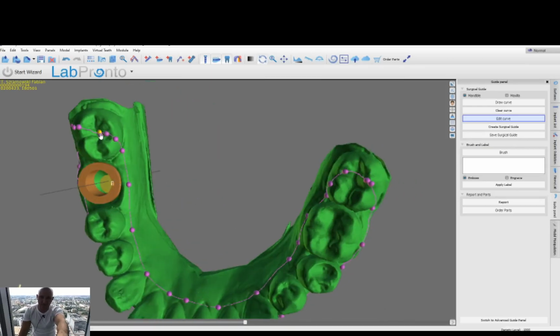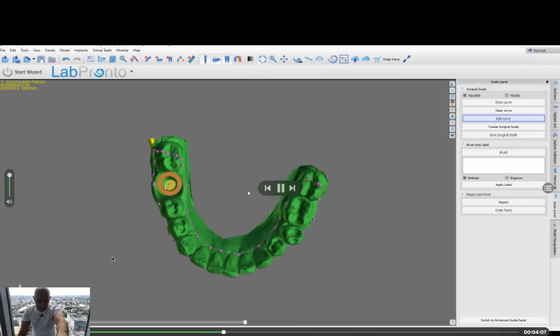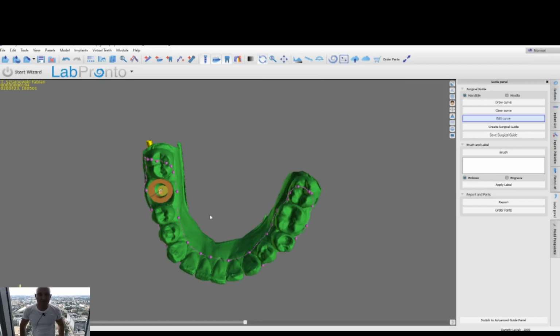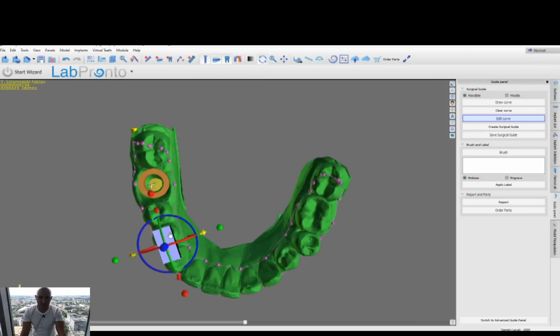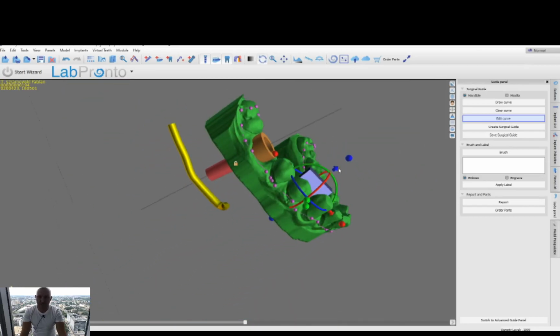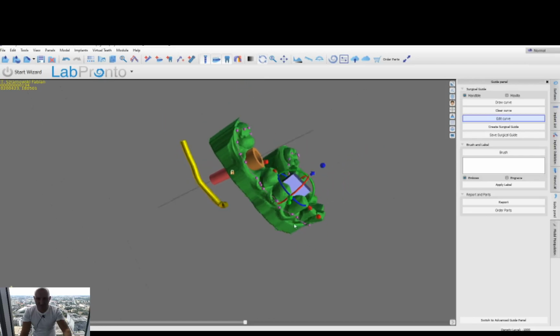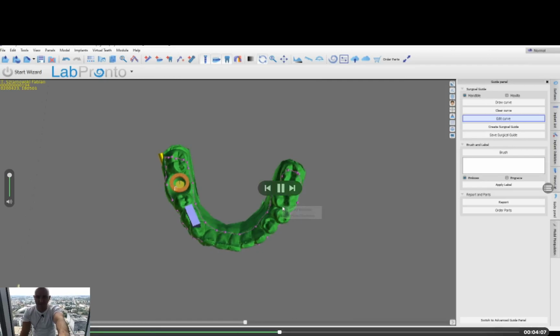If you click with your right mouse button, you can choose add window. The window will be a window in your template in which you will be able to see if your template fits correctly on your teeth. So we will design two windows, so that on the 3D printed template we are able to check in the patient's mouth if it fits correctly. So for this template I created two windows.